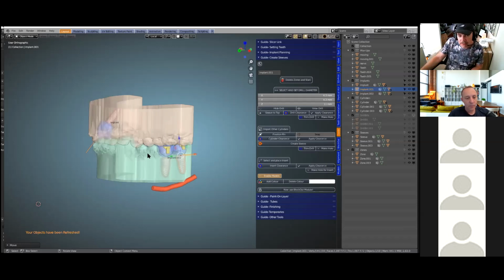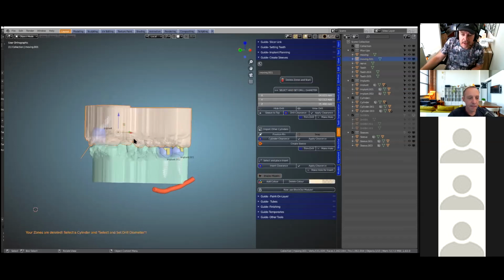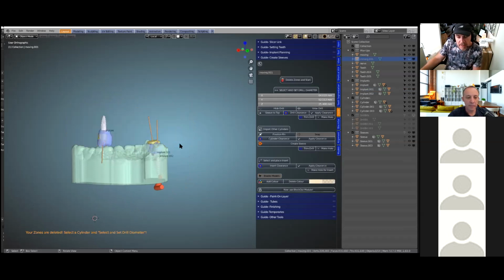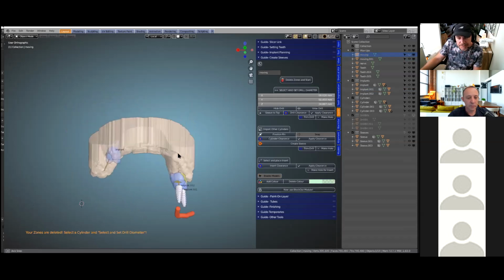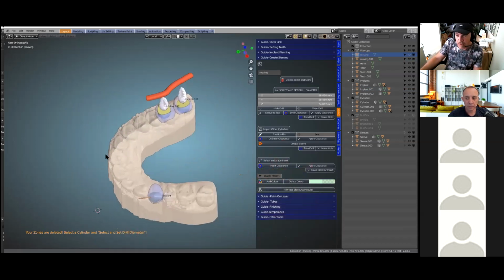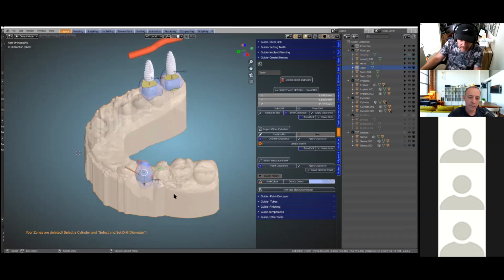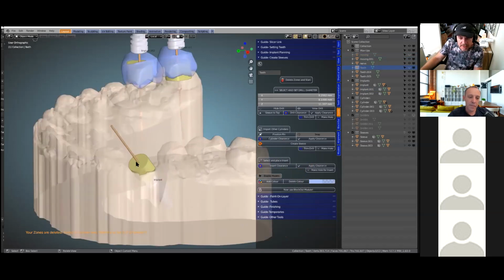All right. So let's do the top one first. The first thing we're going to do is delete zones and start. And this means we can select these objects now. I'm going to hide the lower one, and we can select this one, and we can hide this one.